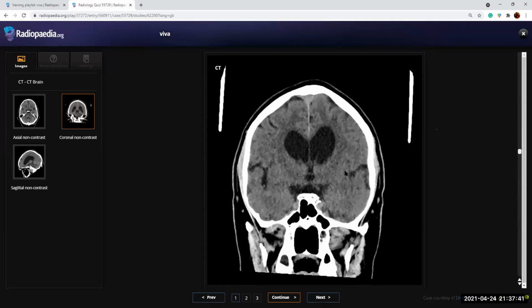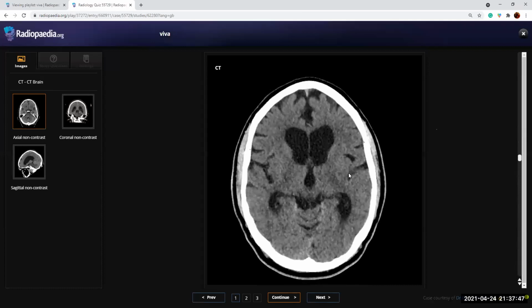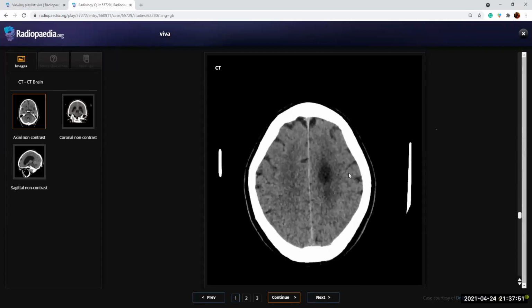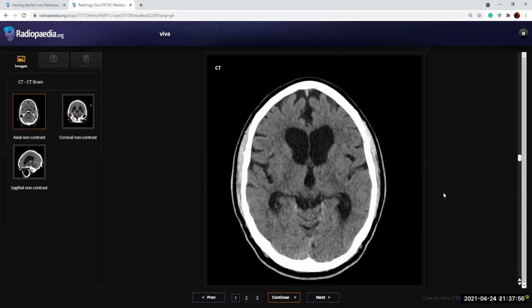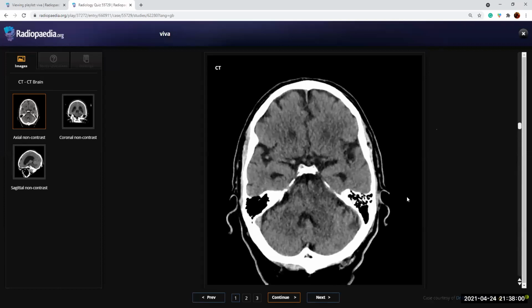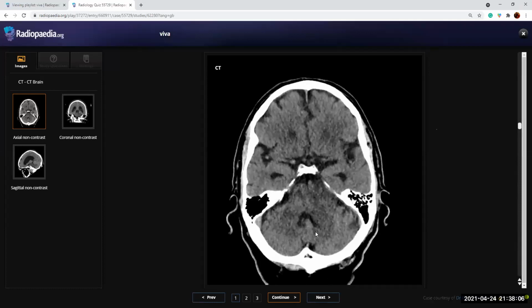You just have a look at the axial images again. Yes, please. Okay. So if this is not a patient of NPH, then I would like to take this case further, because I suspect that there is a focal lesion here in the left inferior cerebellar peduncle and part of the left cerebellar hemisphere, with a contrast enhanced CT test.